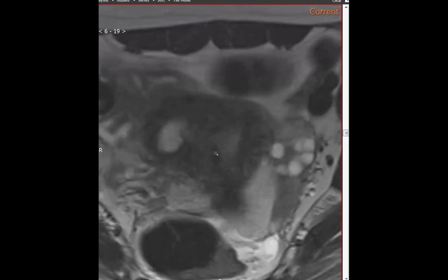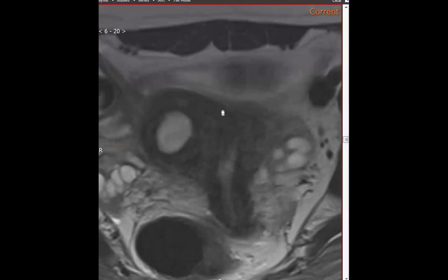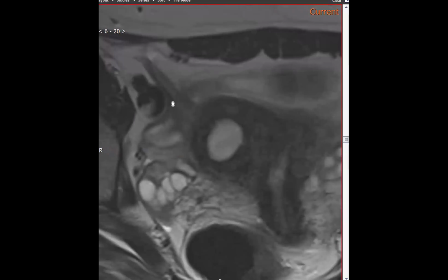Another pointer towards ACUM being this is the round ligament of the uterus. So it's usually at or below the round ligament of the uterus. And one thing I'm not sure, maybe I read it somewhere, maybe it's more common on the right side, but I may be wrong on that. I was thinking about that because the cases that I've seen have been predominantly on the right side too. So I think I've read it somewhere. Yeah, it's more right side.